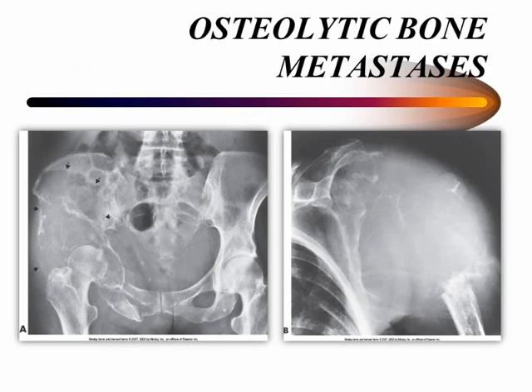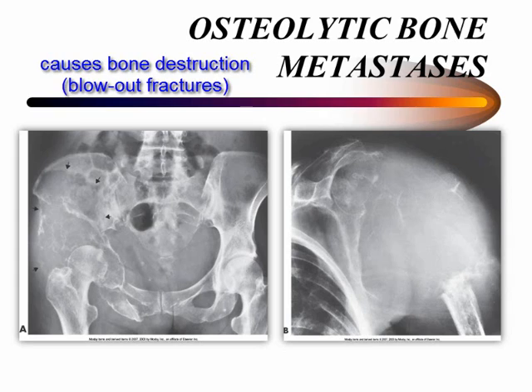Metastatic disease may produce a broad spectrum of radiographic appearances, which include osteolytic, sclerotic, or mixed. Osteolytic metastases cause destruction without accompanying bone proliferation. They develop from tumor embolic deposits in the medullary canal and eventually extend to destroy cortical bone.